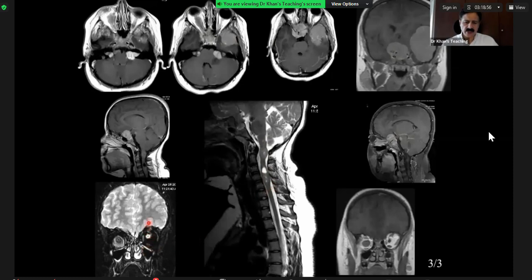Another point to remember here is that an examiner can show this sequence to you in the beginning, and in this sequence you have to develop your eyes to look at the optic nerve. Look at the optic nerve here, and look at the optic nerve here, and there is a difference there. Once you pick it up, then you ask for further sequences.